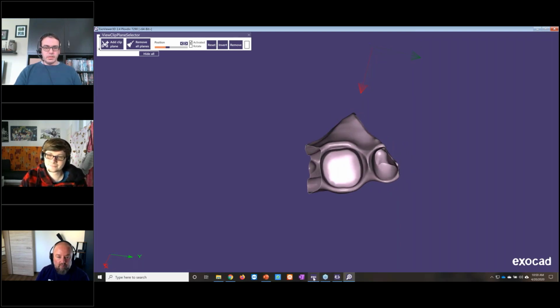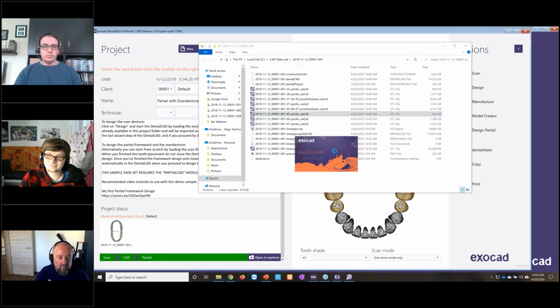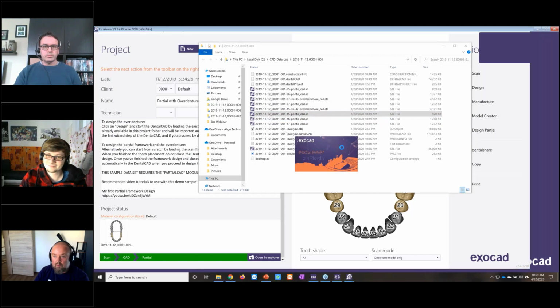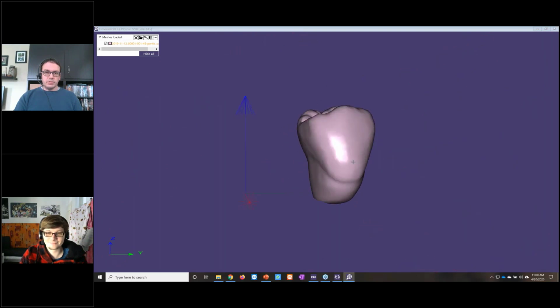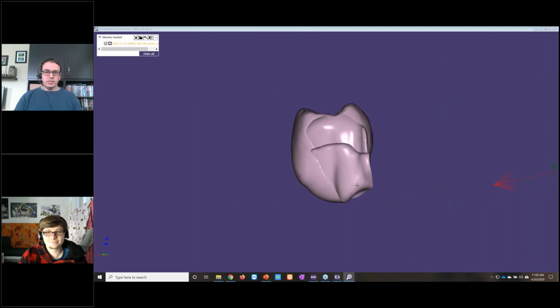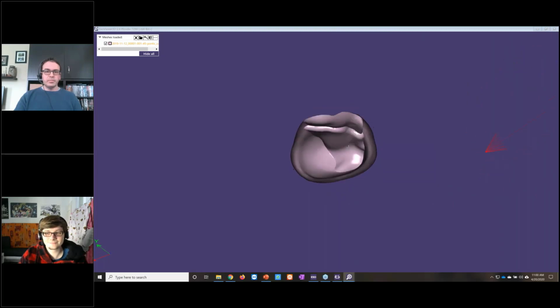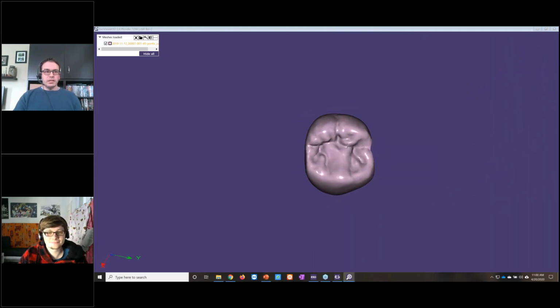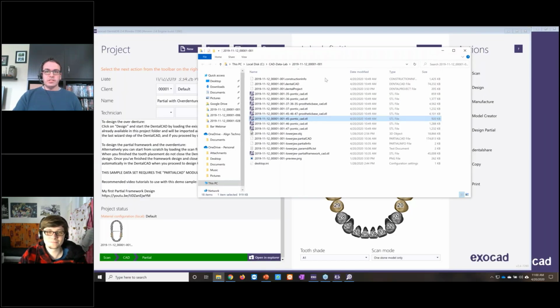And then let's open up a tooth file. Take a look at one of the teeth that's been adapted. So actually, yeah, this is a good one. So this is one of the bicuspids. This would be up against the minor connector, and you can see material's been removed from the tooth to make sure it fits up right against that minor connector, as well as down in the tooth pocket underneath. So all that's done automatically at that step to adapt the gingiva surface there.